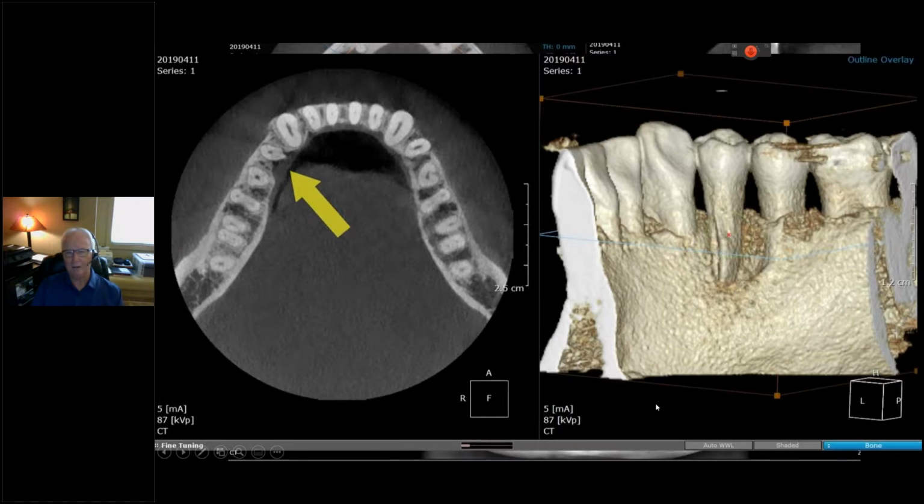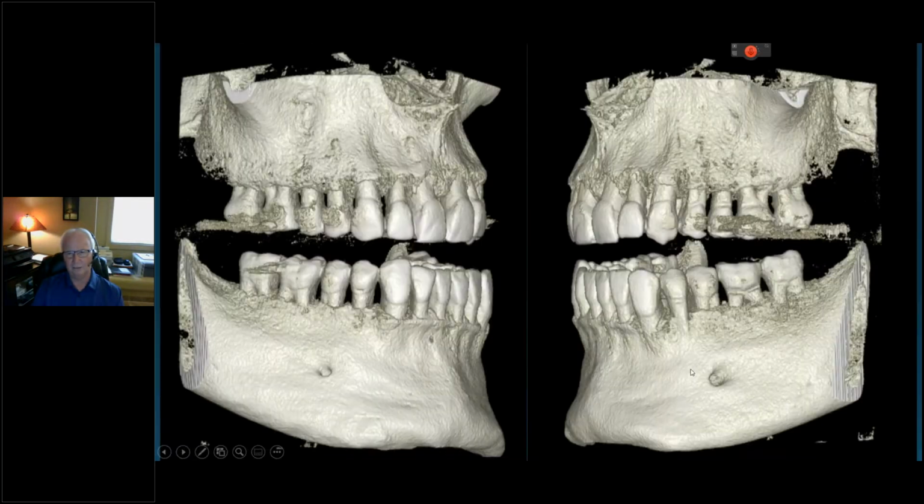And it could be. I've had patients in the past who had some inflammatory tissue there. They said, yeah, I dig at that area with a toothpick or whatever, and I always fish stuff out, and they can actually create a granuloma or some type of reactive lesion by playing with it. But this one turned out to be plain old periodontal bone loss, thank goodness for the patient. But that one was removed and sent for histologic evaluation.